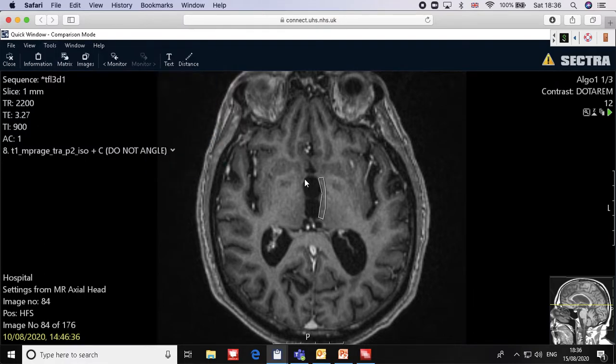Just to show you again, what you have to do: go in between the optic tract and draw the structure in between. If you see the mammillary body, you draw it. Then go to the cut below the anterior commissure and draw a 3 mm structure on either side. It's dealing with the gray matter, or the nuclei you can see there. Just interpolate. The last slice of the hypothalamus is nothing but connecting the anterior commissure with the posterior commissure, and this is how the guidelines tell us to draw the hypothalamus. I hope this is useful for you.